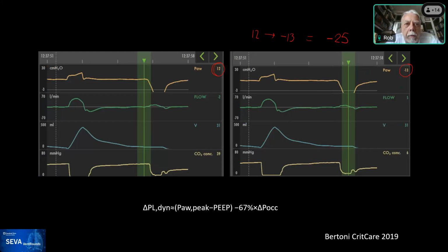development of inaccuracies in the equations and how people write the numbers and even the terminology. So I don't have time to get into all that, but basically, mathematically, what you're doing is you're taking the lowest pressure, which you can't see graphically, but you see it's minus 13, right? And then you subtract, so that's the end pressure, and then you subtract the start pressure. Why? Because it's delta P over delta T.